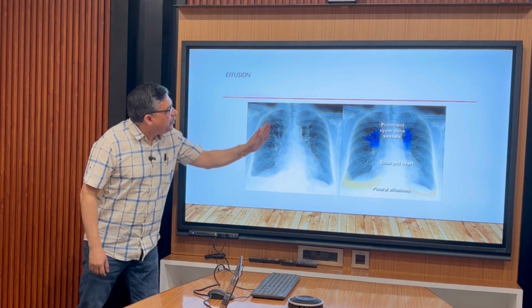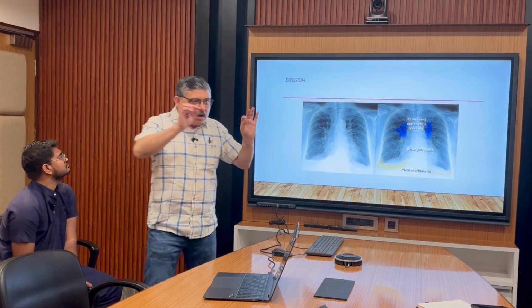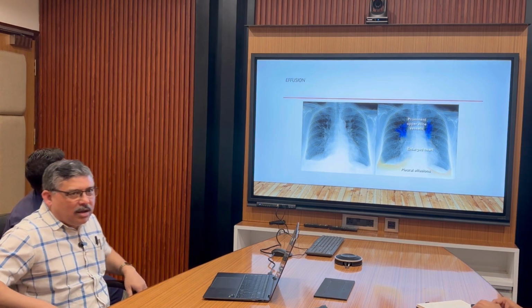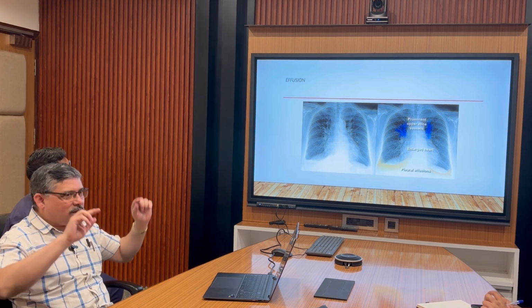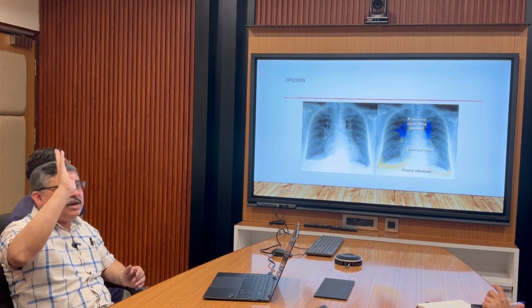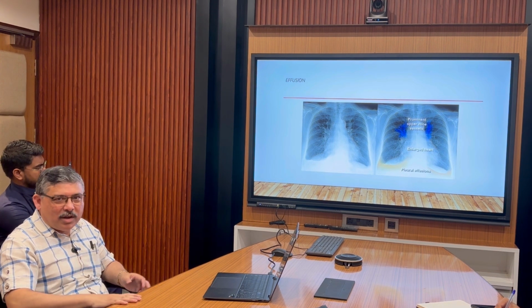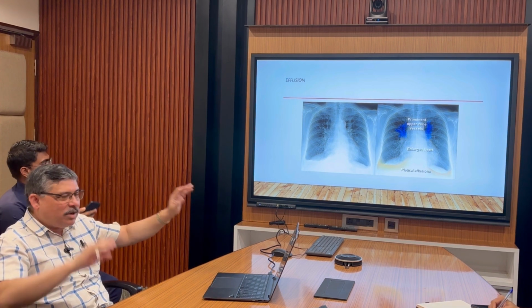and these vessels that you see, the radiating vessels from the hila, you should be able to see these till around 2/3 of the lung. In the lateral 1/3, you should not be seeing blood vessels like white structures. And the apical upper zones are more ventilated and less perfused, no? So the perfusion should be less. So there should not be blood vessels visible in the apical part.